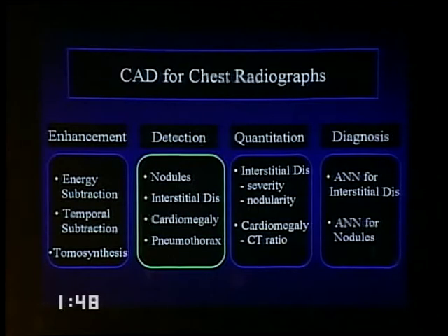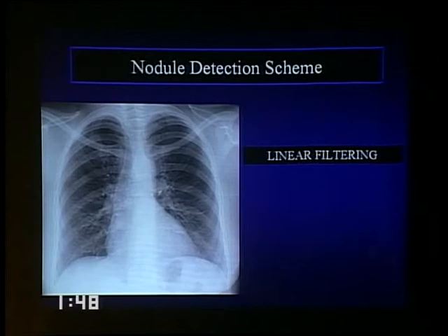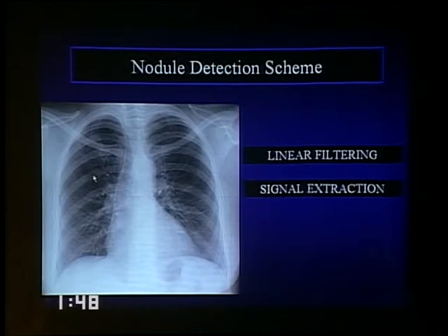Okay, let's move on quickly to nodule detection and other kinds of computer-aided diagnosis. This has been a long-standing project at the University of Chicago and elsewhere to automatically detect nodules in chest X-rays. And it's approaching maturity, but it's a very difficult task to achieve automatically. This is a faint nodule in the right upper lobe.